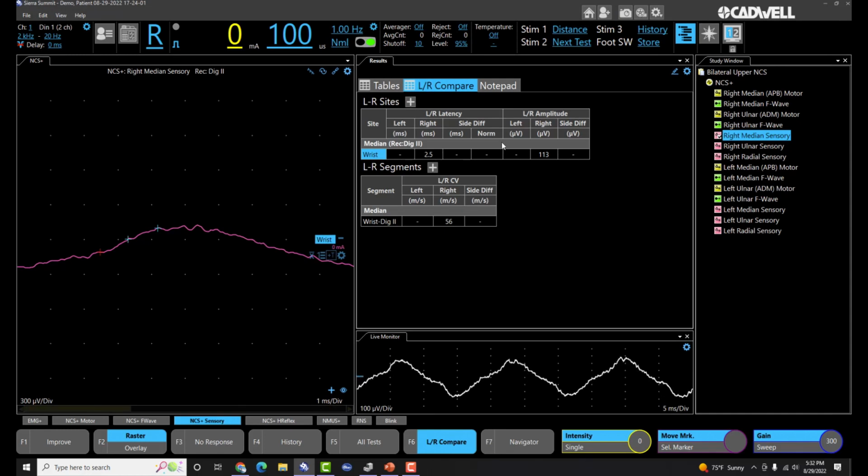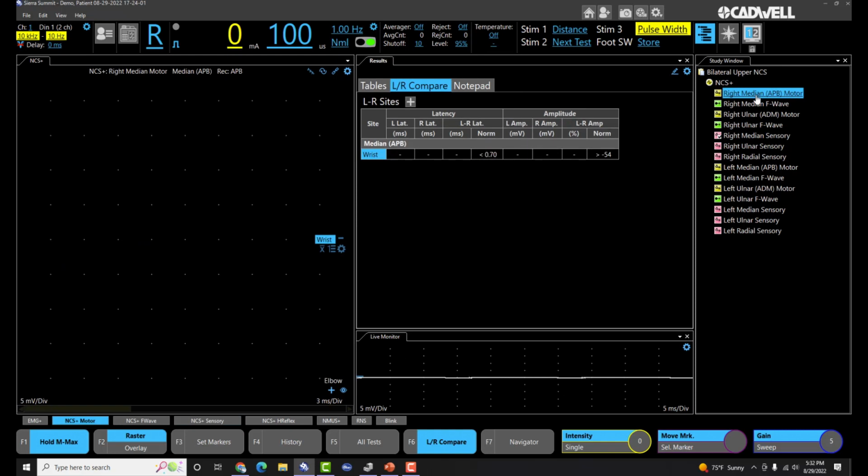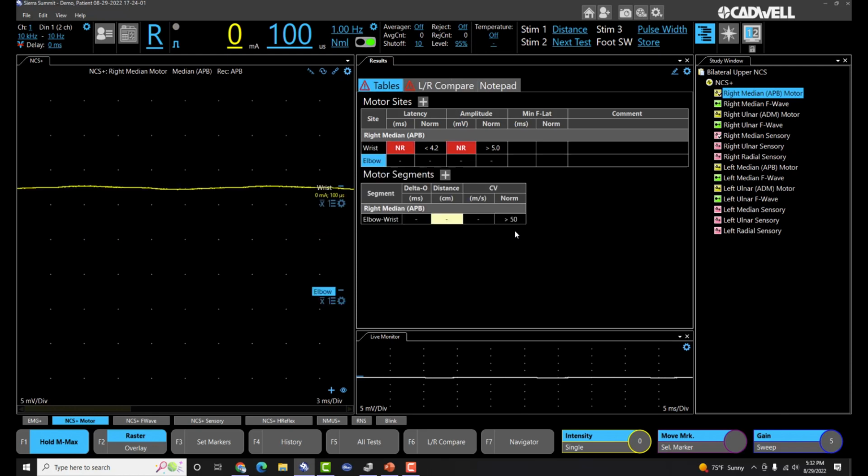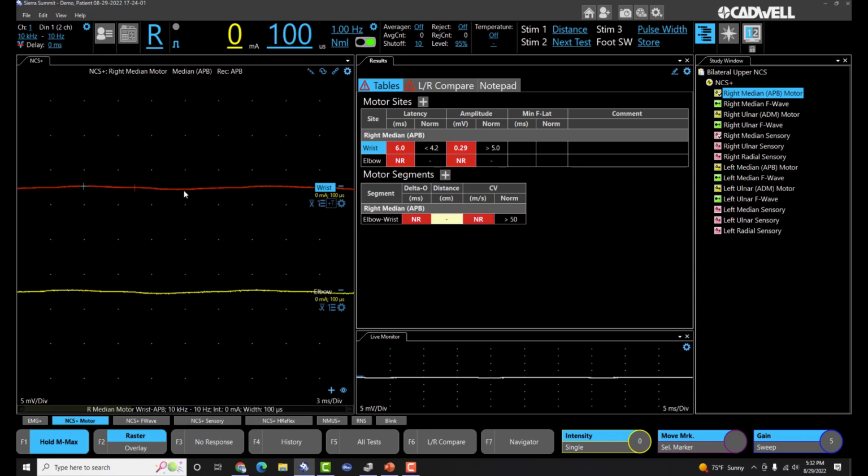The benefit of doing this is always so that you can test out all the changes you've made while you're in the test. So now that we've edited reference limits or changed our columns and headers, you can go ahead and collect data and make sure everything's showing up how you expect it to. And when you place cursors, you'll see all those changes reflected and make sure all the results are showing up how you want to see them.